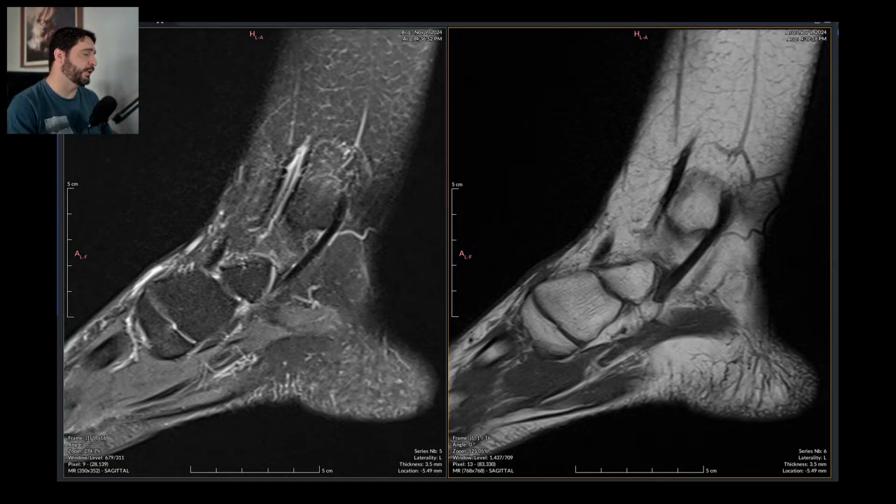No, it says patient says she has arthrosis. She is 51 years of age and she has arthrosis. It's been like that for 5 years, and her ankle hurts and got worse 4 months ago. So this is for arthrosis, not trauma.